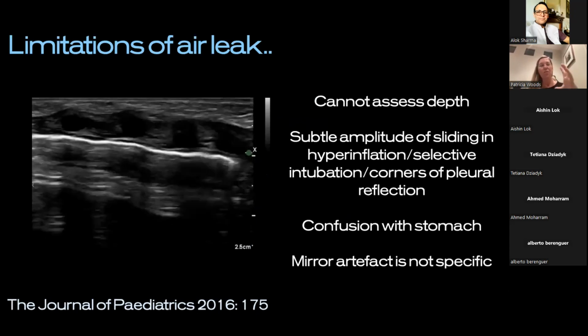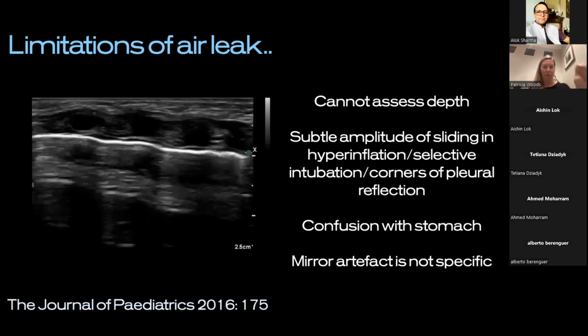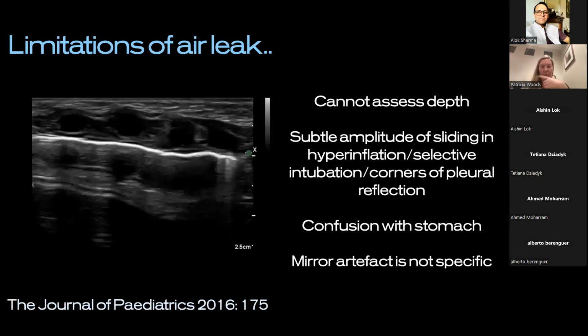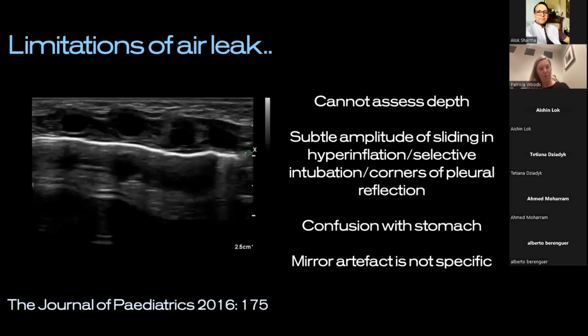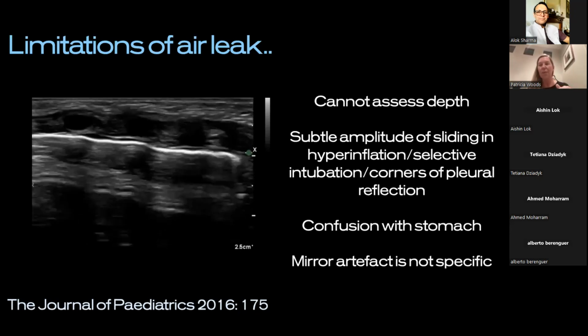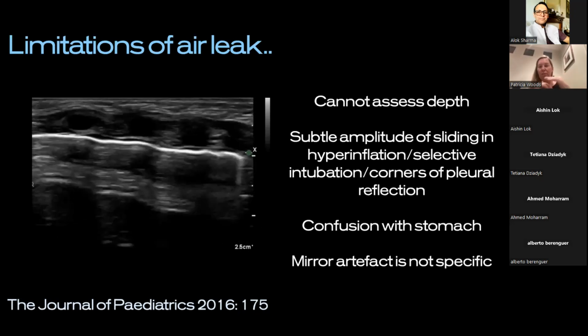So please don't use ultrasound and look down the scale at the side and go, okay, so I can see the ribs, the pleural line, that's about a centimeter. My focus is there and I can see 1, 2, 3. Don't do that, okay? Know that there is separation. You can't diagnose, end of story.